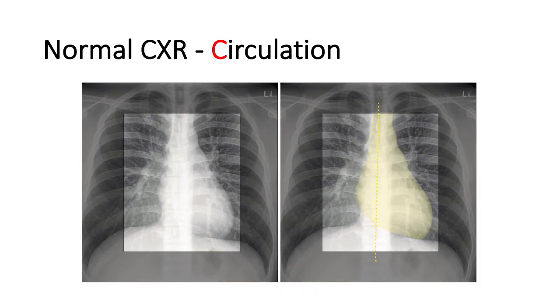Now we're on C for circulation. So we want to check the cardiac position. Is the heart located 1/3 to the right of midline and 2/3 to the left?